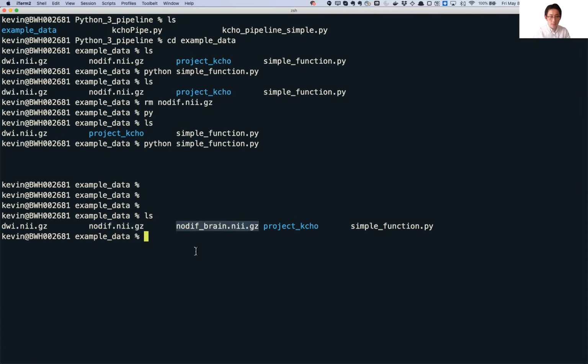You just made a Python pipeline running fslroi, and then bet, okay? And you can just add on the other functions. You can add on eddy, you can add correlation analysis to it, or you can just use NumPy to extract others. You can change other values. That's just as simple as it goes.